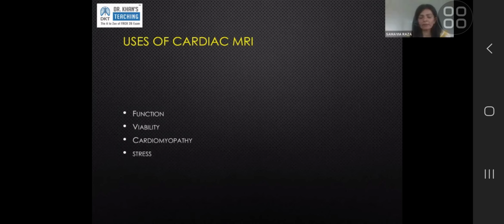The viability issue with cardiac tissue is you assume that anything that is showing scar for more than 50% of its thickness is non-viable. That is the rule of thumb we use. It is somewhat crude, but that is how it is reported on cardiac MR. So if you would see a segment of the myocardium in the LAD territory and it is more than 50% enhancing on delayed myocardial images, I would say that that is non-viable segment.